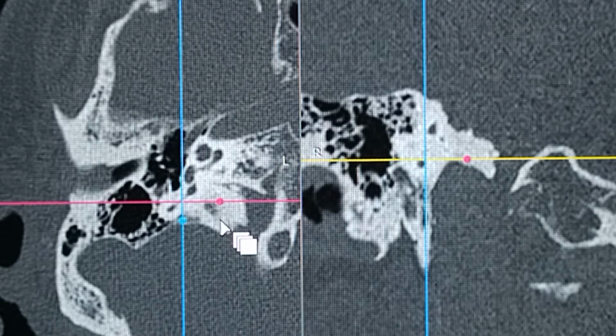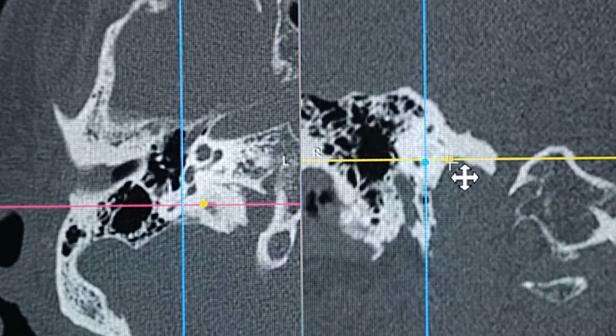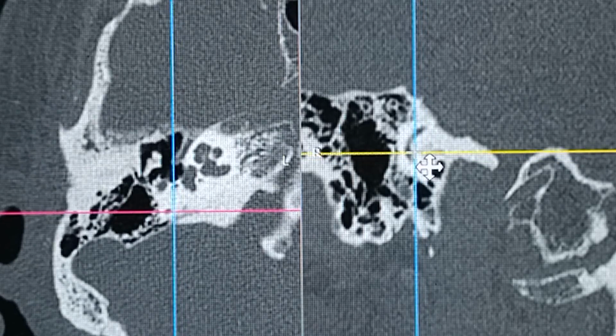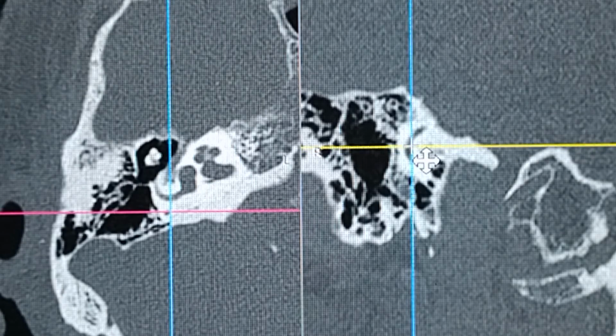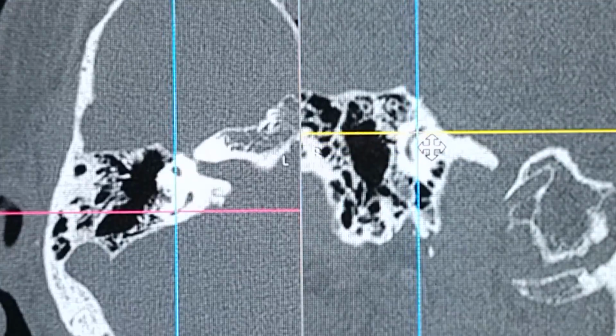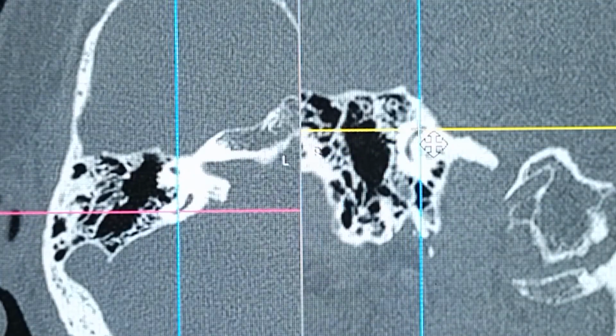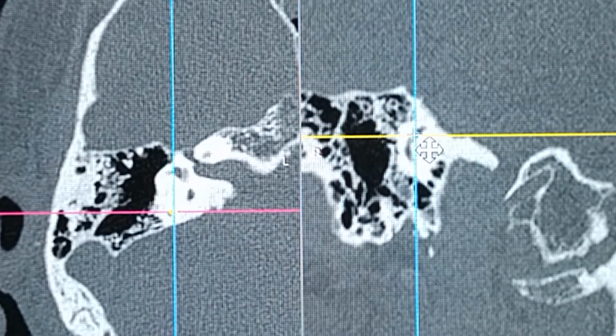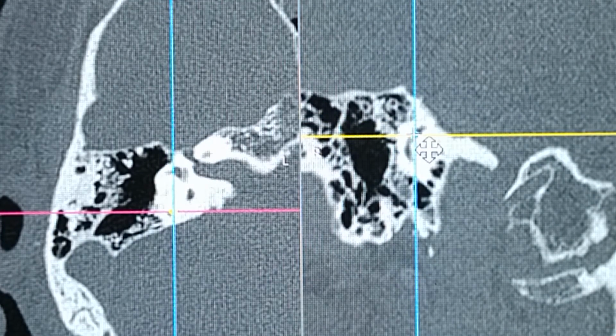So that's the most posterior canal, and on the coronal section you can see this, this is a posterior semicircular canal right there. You can actually see on the axial at the same time, that's not the lateral but the posterior semicircular canal on the coronal scan. Very easily seen. Okay, so this is basic anatomy of all the semicircular canals you can see over here.